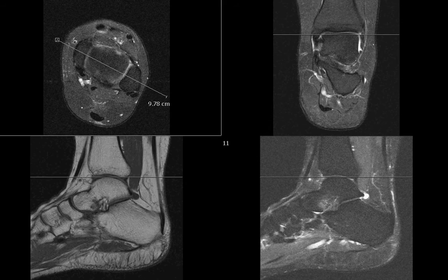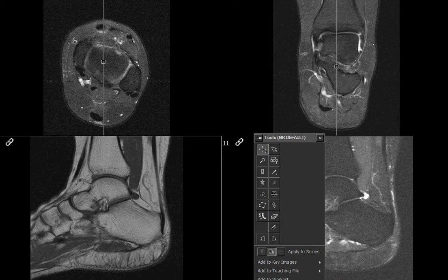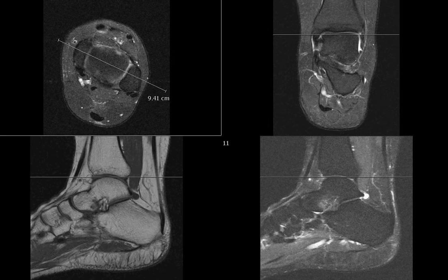Okay, and then similarly, on the sagittal planes, which don't look as bad or aren't as noticeably wrong, but look at the cut line. Again, now it's totally perpendicular to the table position instead of being perpendicular to the ankle. So what we would want for sagittal images would be lines that are perpendicular to this line. So sagittal images of the ankle should be something like this orientation. Okay?